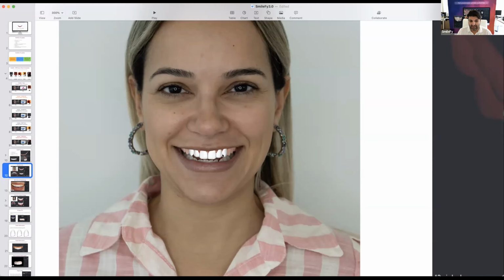In my humble opinion, I developed the best 3D rendering system in dentistry to display the 3D design in a very natural way. Let me show you how that looks. If I'm wrong, please show me something better. I'm very humble in this area, but look at this rendering.